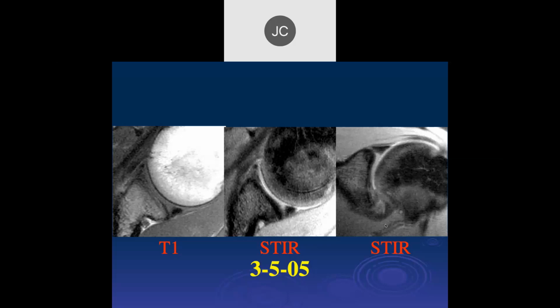All right, so there is some attenuation of that anterior inferior labrum. I think the tissue is displaced. Okay. So this patient had an anterior dislocation, maybe a little bit of signal here. It's not as black as you would like. The cartilage looks pretty good. So this is on 3505.